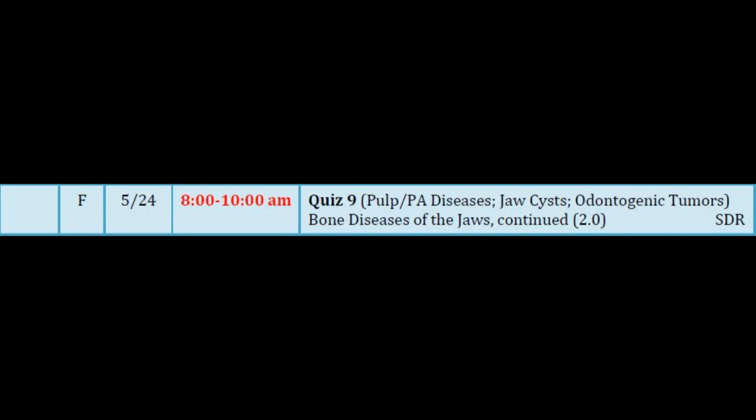All right. What do we see radiographically in this patient? Lucent, opaque, or mixed? It's a mixed lesion. Do you notice anything else about that mixed lesion? It has distinct tooth-like structures. It's well-defined, with new tooth-like structures. So there's really only one best diagnosis, and that is compound odontoma. Compound means multiple.